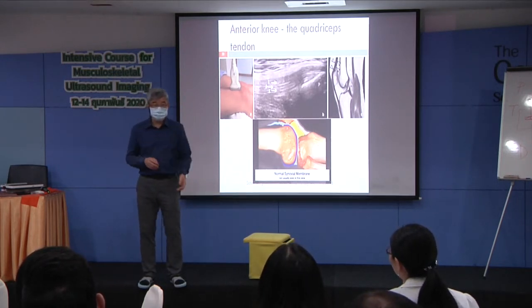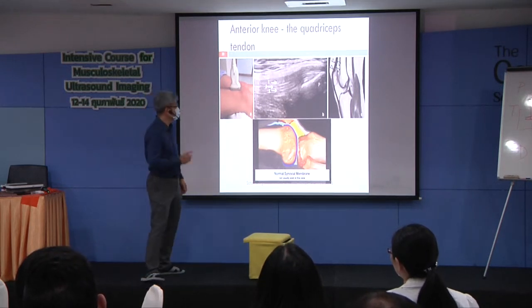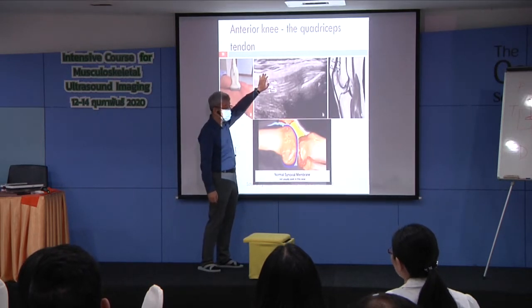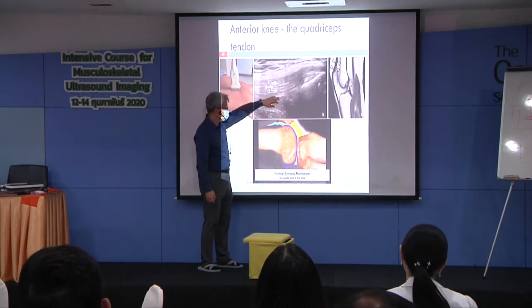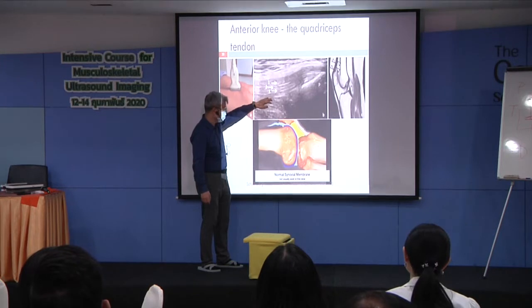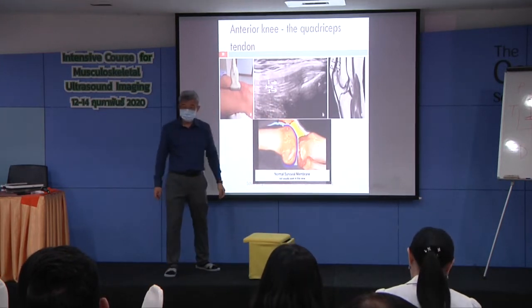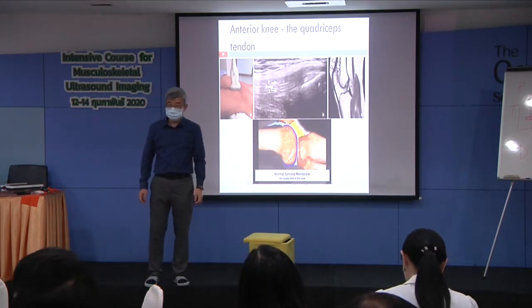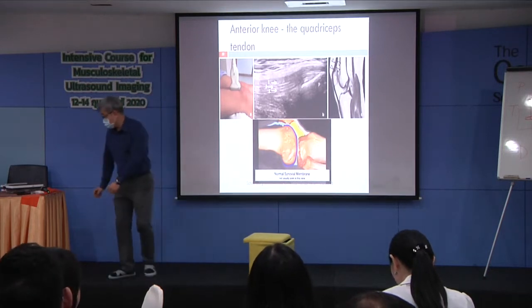After these classes, when we communicate about imaging, please, skin, fat, superficial aponeurosis, tendon, fiber, interface between the fluid, fat, cortical line of the bone, all need to be perfect. Then we discuss what kind of patient you have. Okay, cool.